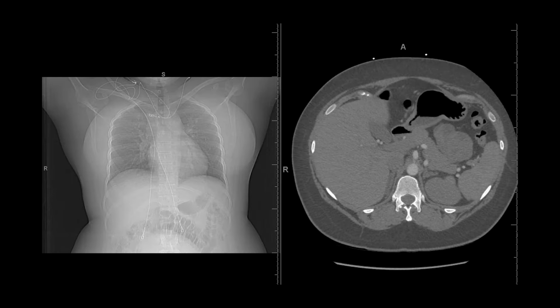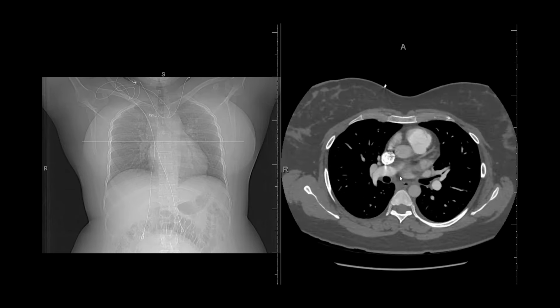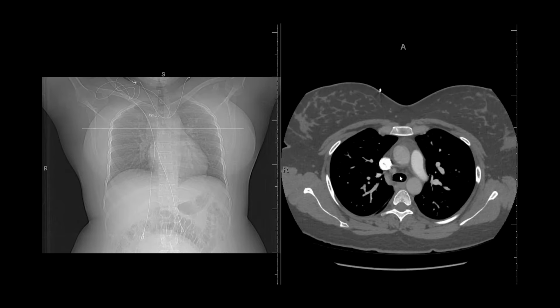Contrast is delivered through the veins, and it contains iodine, which will show up as dense material within the vasculature first, and then go to the soft tissues and highlight the different soft tissues so you can see them better. When you do give contrast, you usually inject it from one of the arms. Then you have to choose when you scan the patient after starting to give the contrast. And that depends on what you want to investigate.